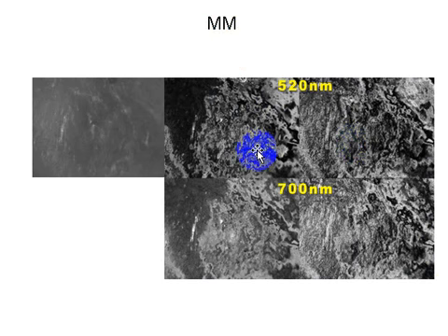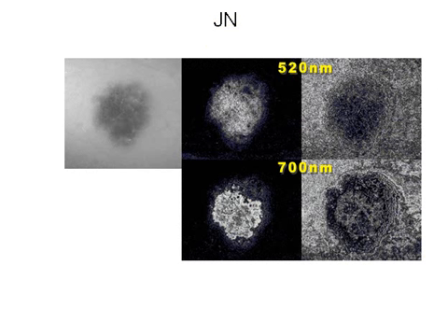between the two algorithms. So let us go to the first one, which is junction nevus. You can see that the DOSI system produced and emphasized boundaries for an area here in the original picture, which produced more scattering.